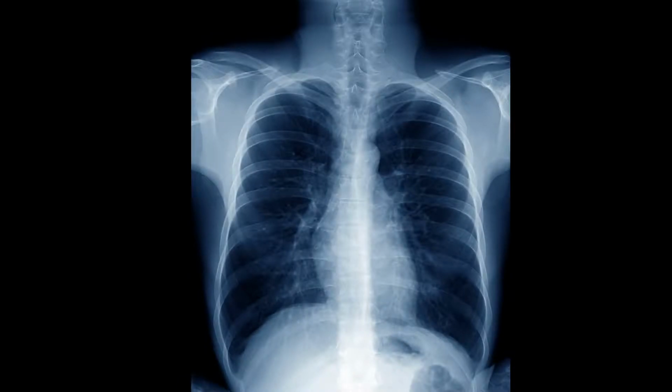In addition to the core structures we would expect to see on a chest X-ray, such as the heart, diaphragm, trachea and lungs, it's important to identify whether there are specific features seen on the X-ray to determine whether there is a good level of exposure. We should be able to identify the apices on either side of the lungs, because these are significant areas where pathologies may present, and we'll come back to this later on in the video.